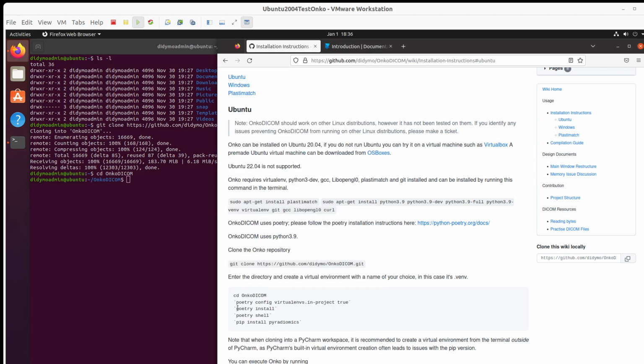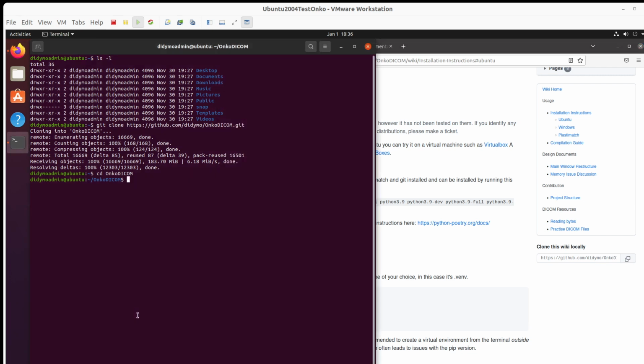Okay, so now that we're inside the directory, we use poetry, and this takes a long time. All right, so we're going to be here for a while.